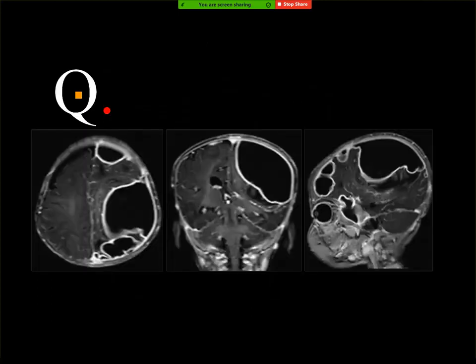No, epidural hematoma. Abscess. Epidural abscess. Empyema, exactly. And then we think that this is epidural or hygroma. No, hygroma does not enhance with contrast. And you see, this is marginal enhancement. Empyema, epidural or subdural? Epidural. It's epidural, subdural.